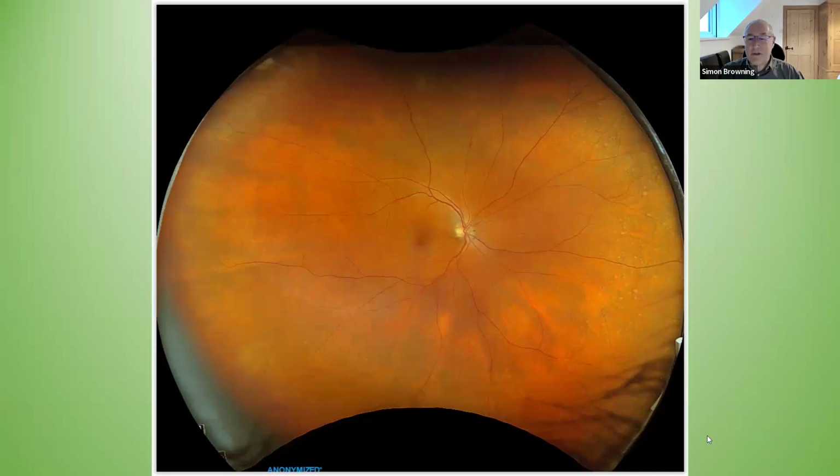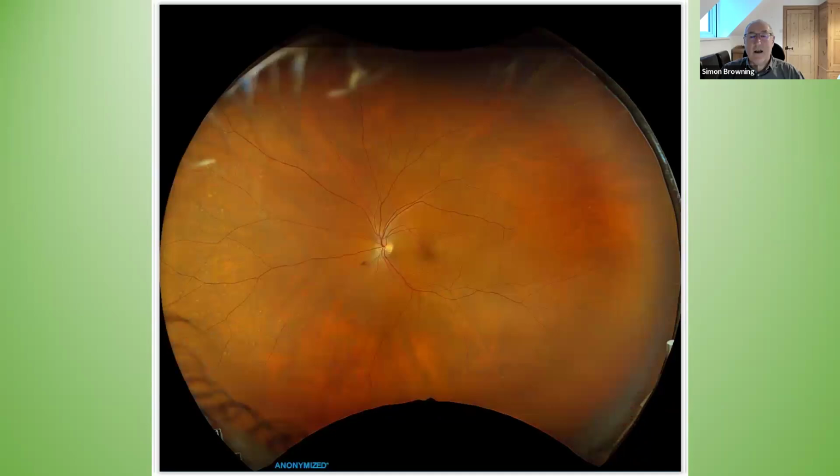So this is the sort of thing that we're going to see when we're looking at drusen. These are classic, very well-defined spots, pigmented around their edges, very much in the nasal periphery. You see a few more scattered around here as well. When we look in the other eye, they're very normally bilateral, so you'll see exactly the same sort of pattern in the other eye. These are not going to affect vision, but they're classic signs of aging and of a retina that has been under stress. This is where I commented about the gradual degeneration that you'll see over time.